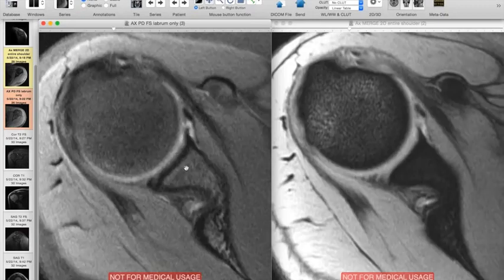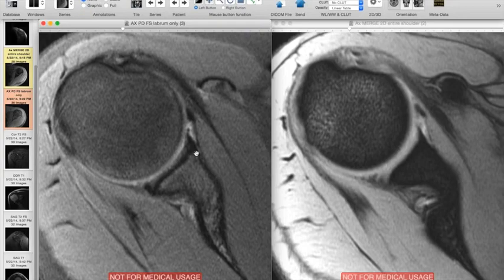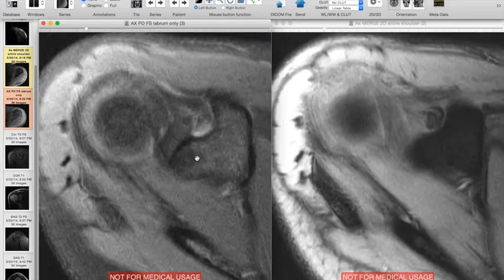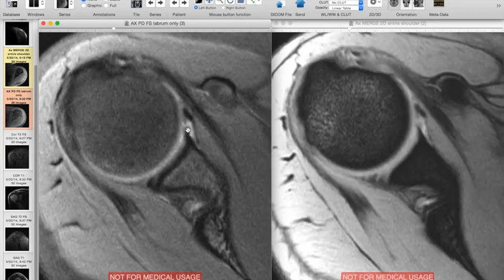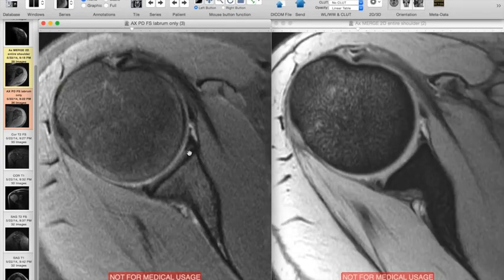But what I do is you want to look at the anterior labrum, and so here we're anterior superior. Labrum is starting here, and it's a pretty nice triangular structure that can insert on articular cartilage right along here. It should be pretty sharp anteriorly, nice sharp corner there.